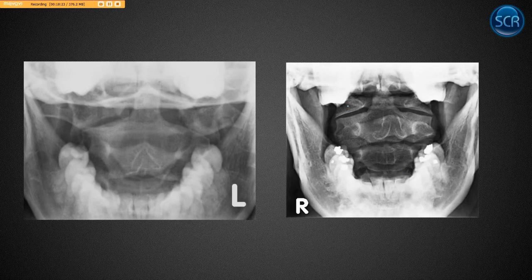This one, on the other hand, compare and contrast these. This is someone who I think took a dive off their motorcycle, little accident. So they had an axial compression injury, and then you can see their atlantoaxial joints don't line up here. So these are moving in opposite directions, which means that ring is not intact. So they fractured their C1. That's a Jefferson fracture. It was normal on every view except for this one. So sometimes this is all you get. So make sure if you get an open mouth view, you look at that alignment.